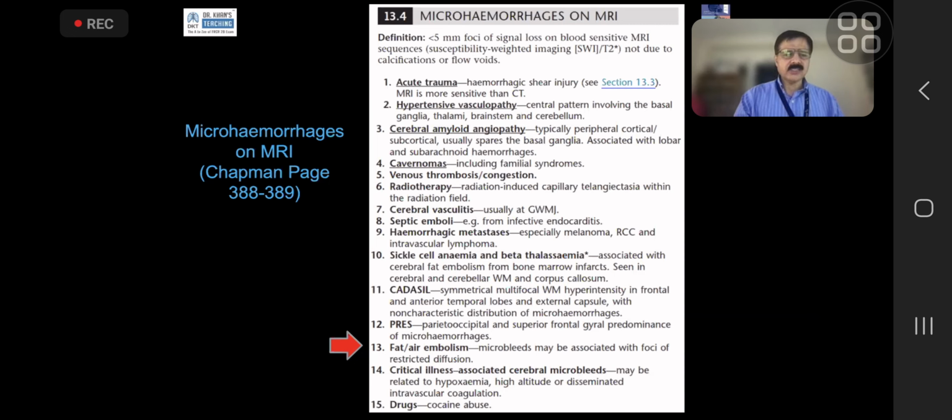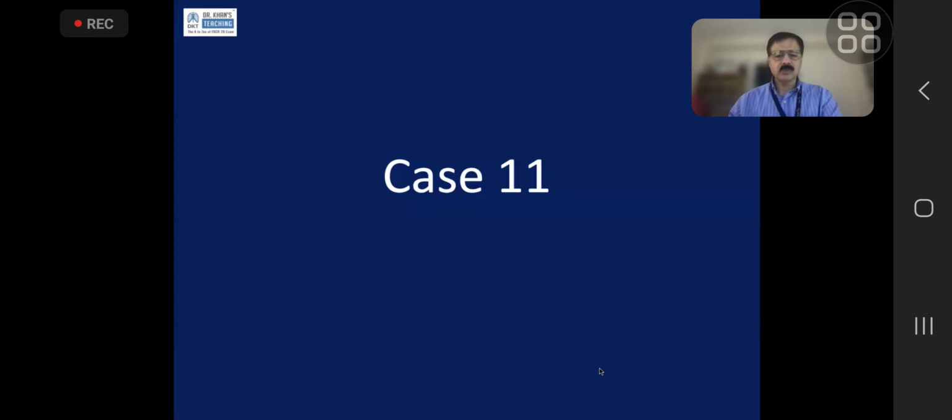And in the brain, this is the finding you see, a shower of low signal, because it can show restricted diffusion in the acute phase, but usually that is lost within 1 or 2 days. But the microhemorrhages is what you are talking about.